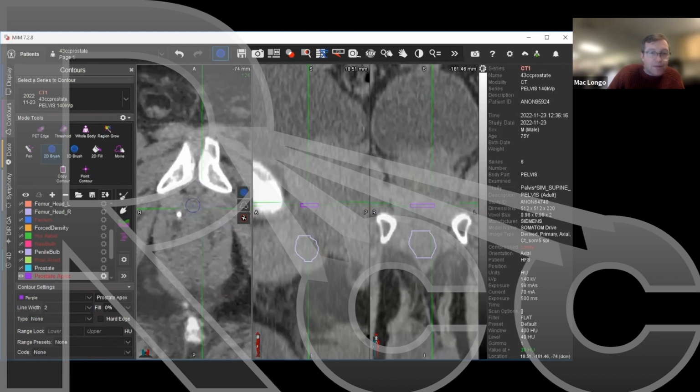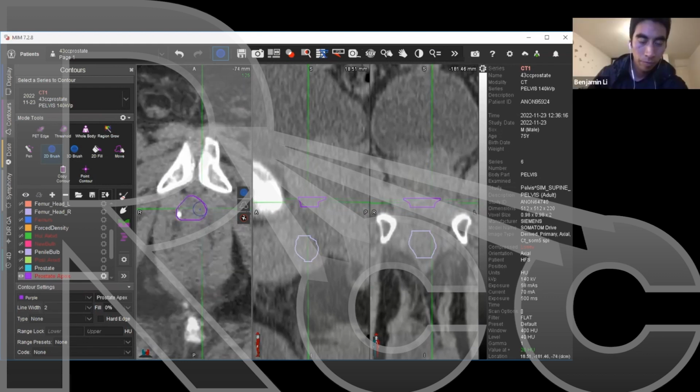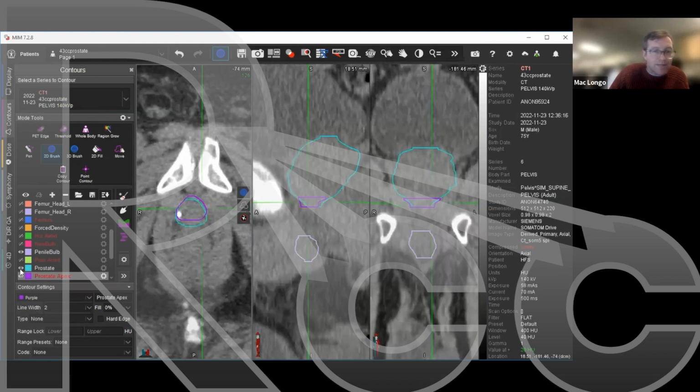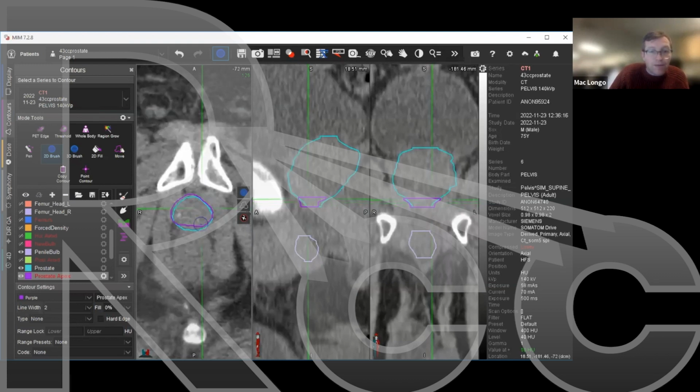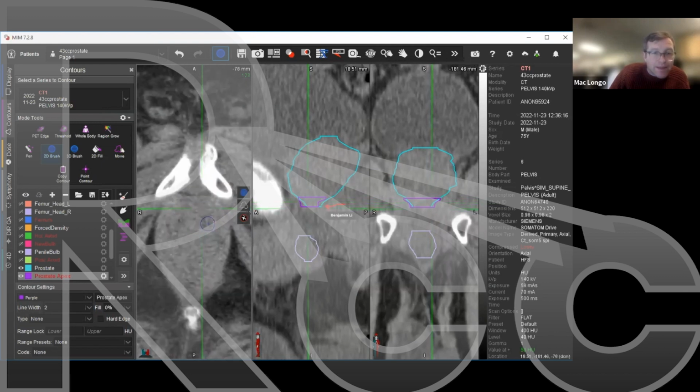And then as we go, this is going to be rough, we're more clearly seeing the prostate come in here. So, as a challenge to myself, let's turn on the prostate contour that I contoured. Okay, so there are subtle differences there, but keep in mind, I used my MRI scan.